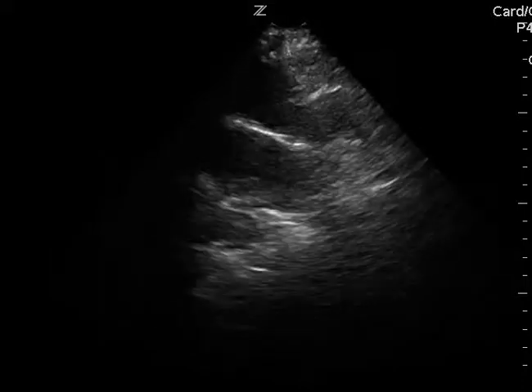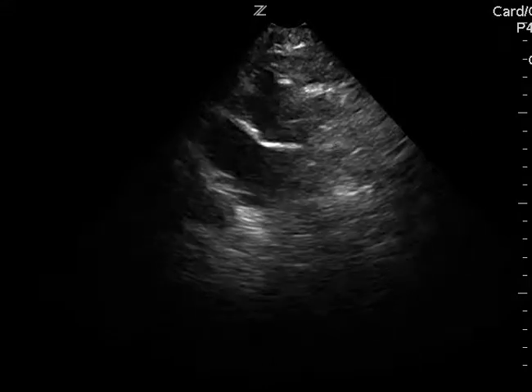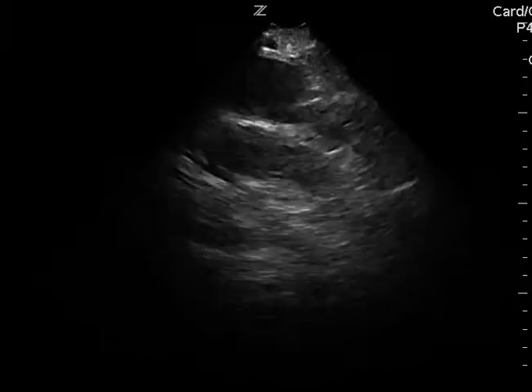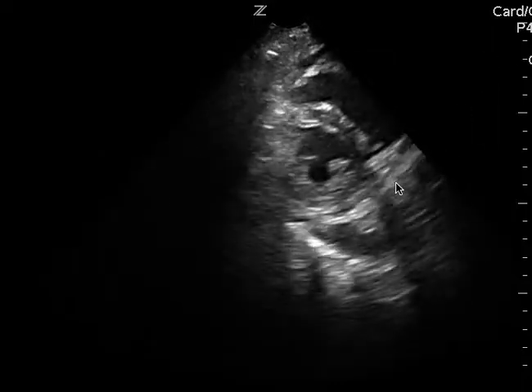There's a cardiac ultrasound, and I apologize for the quality here. For some reason, QPath is making this very disjointed. This is two views here where it's challenging for me to exactly see what's going on. It's a cardiac ultrasound. But then you move here to a parasternal short, and I think this is very helpful.